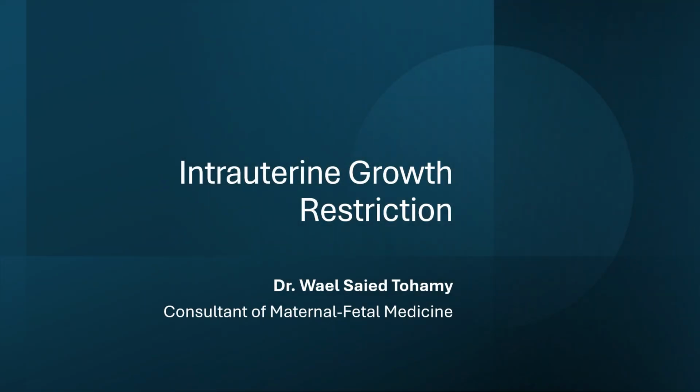Isn't just about small babies, it's about survival strategy. Every restricted fetus is fighting a silent battle for oxygen and growth inside the womb. In this video, we will uncover what's really happening behind those Doppler waveforms, how the placenta, the fetus, and the circulation adapt under stress long before things go wrong.